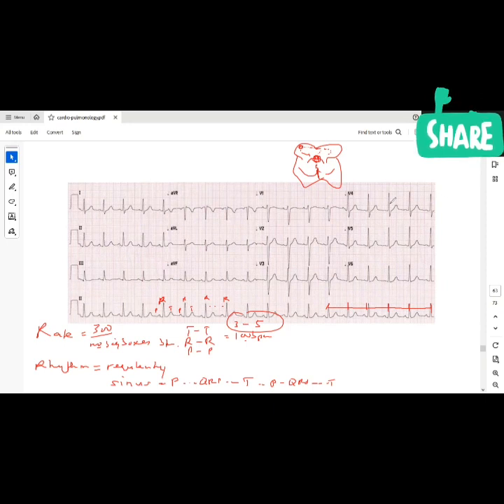The sequence should be like that, which tells me that the origin of the beat is from the sinoatrial node, making it a sinus rhythm. That's super important. Next thing, after rate and rhythm, now you want to check your waves and intervals.